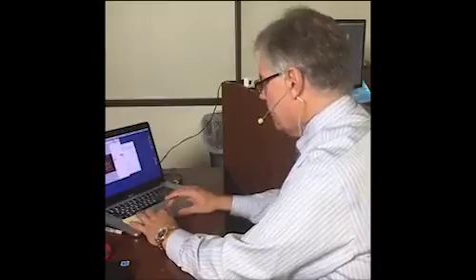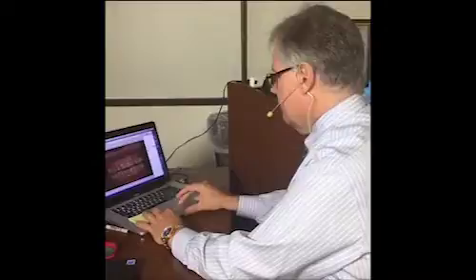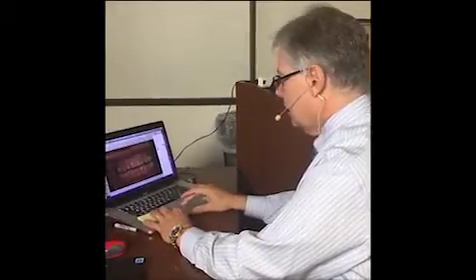I would tell you that my personal protocol, once I've loaded them all in, is to leave them up there and drag them down, copy them and drag them down to work on them, so I always have all my originals available to me. That's not necessary, and a lot of people don't do that. It does take up a bit more disk space because I have lots of multiple images in there. So that would be a personal decision. The only reason I do it is that it leaves me with all 18, and I know I still have originals in case I want to go back and look at how I took that picture.